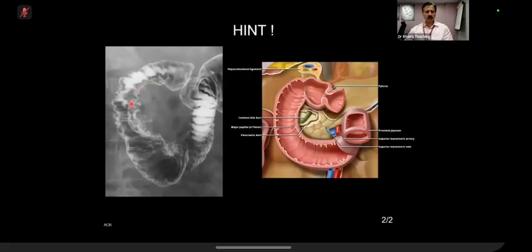Basically, what is happening, as you have picked up, is that there is an extrinsic mass which is infiltrating the duodenum. And an extrinsic mass which is infiltrating is causing some findings. Now, nobody in this era should show you a barium study for this, obviously, and no pancreatic carcinoma should be. This was known as a reverse 3 sign. If you see here, there is an extrinsic impression here. You can understand that the ampulla is here and other bits is here.